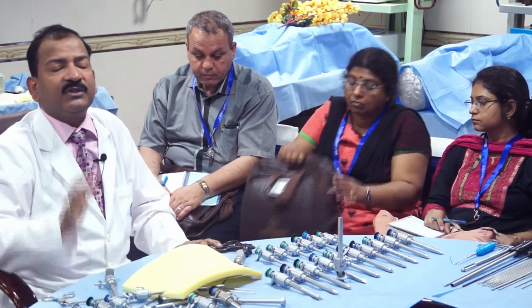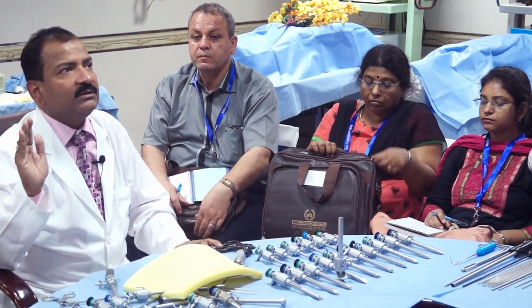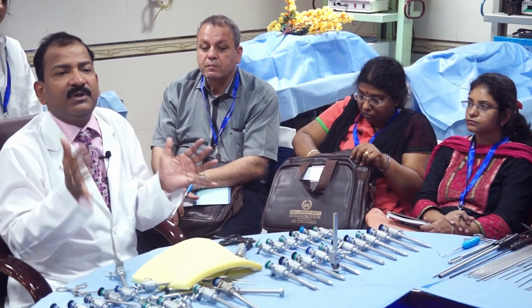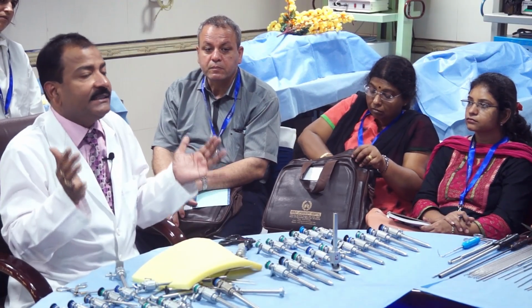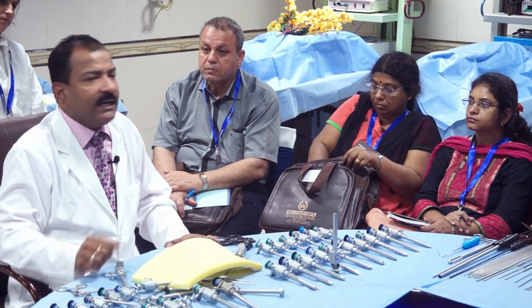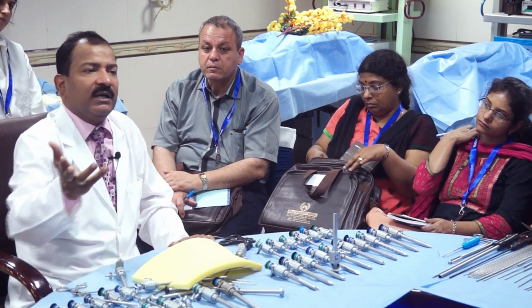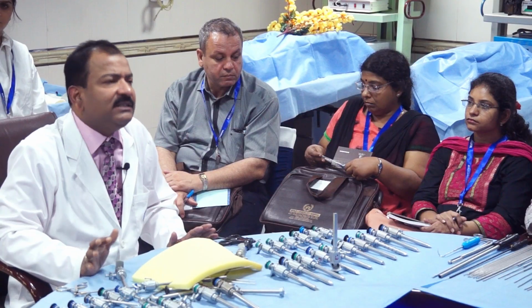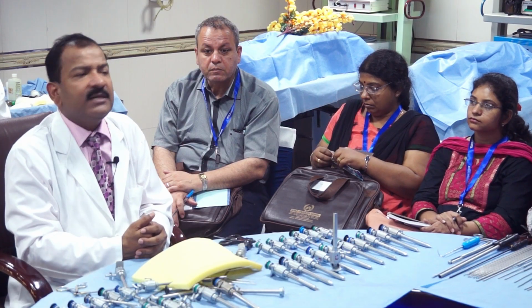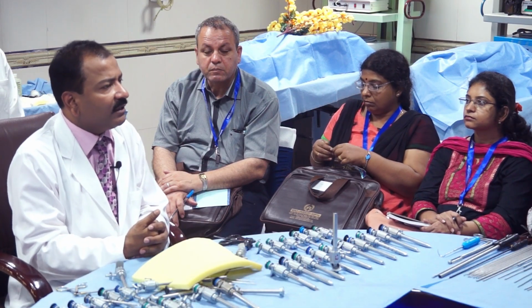So anyway, what I was speaking about, the manipulation angle. If you know the principle of exact mathematics, exact physics, then you don't have any problem. And after that, anybody can put the port for anyone. Because basically what is surgery? Surgery is dissection and tissue approximation. It does not matter which specialization you are doing.